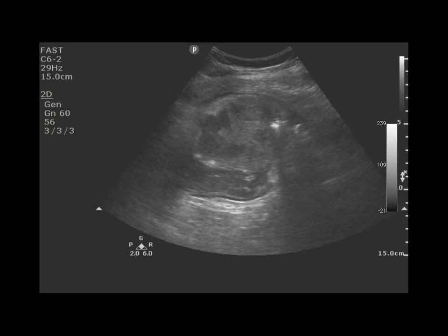Normal colon can be differentiated from small bowel on ultrasound by its lack of peristalsis, its fixed location, and its lack of plicae circularis, those small folds that are within the small bowel wall. In the far field of this image, we can see a segment of colon, and here it has thickened walls. We can also see some hyperechoic fat surrounding the colon, which is suggestive of surrounding inflammation.